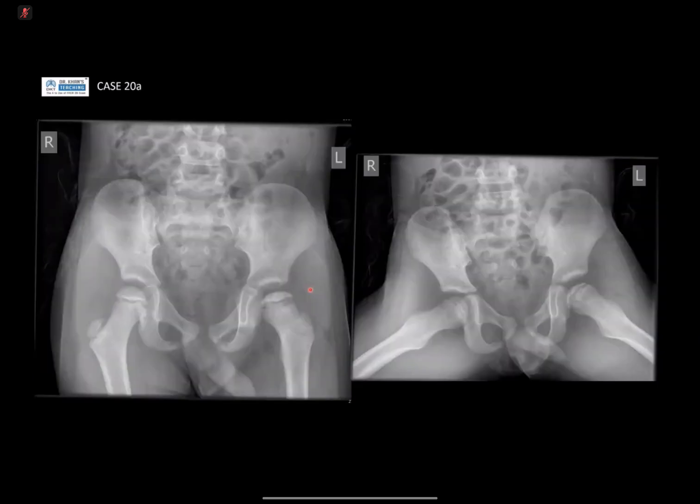Okay, cool. All right, so same MRI, we're going back to the X-ray first. As everyone has mentioned, there is flattening, there's sclerosis of the femoral epiphysis. There is some lucency here, okay, it's not there on the other side. And essentially, the hip is still enjoined, there's no slip at all.